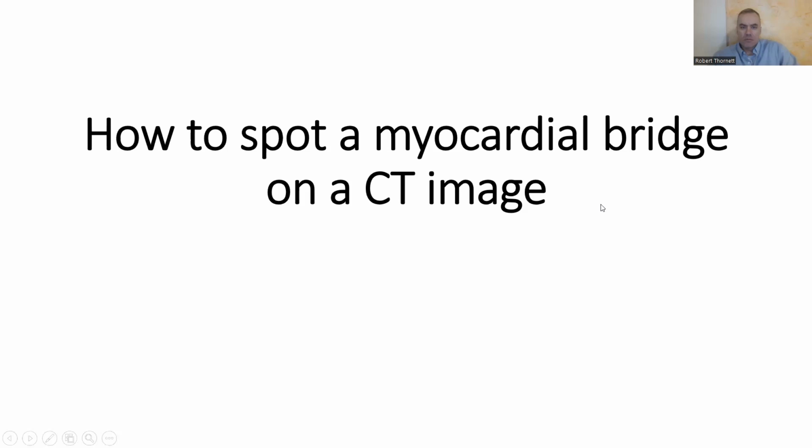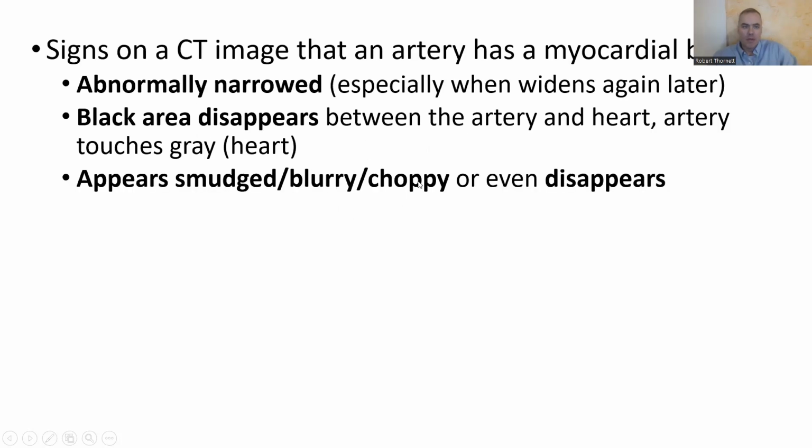And in this video, I want to show you how to read a CT scan image to spot a myocardial bridge. As we go through these images, I will point out some of the details using my pointer, which you can see on the screen. I also have some arrows in the PowerPoint, but I'll use this pointer to point out what I'm talking about.